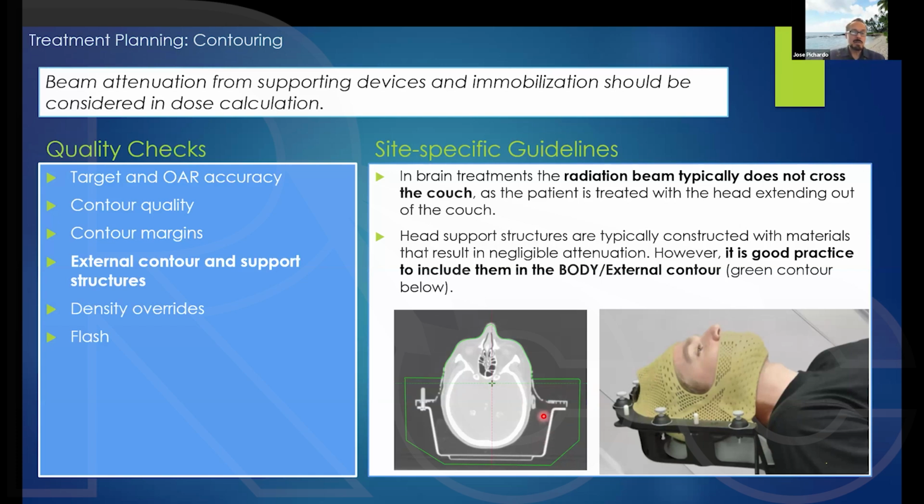Will it make a difference? It depends. In some cases it might, in some cases it doesn't. It really depends on where your lesions are. It depends on how much of this material you're crossing through, right? So there's no clear-cut answer, which is why it's just safer to do it, and then you don't have to worry about it. All right.